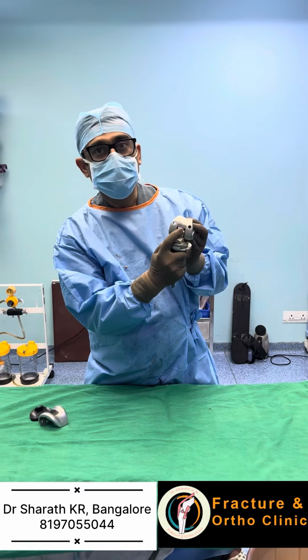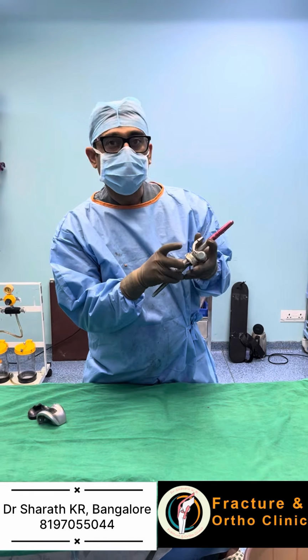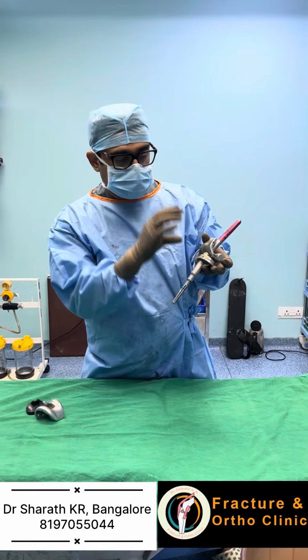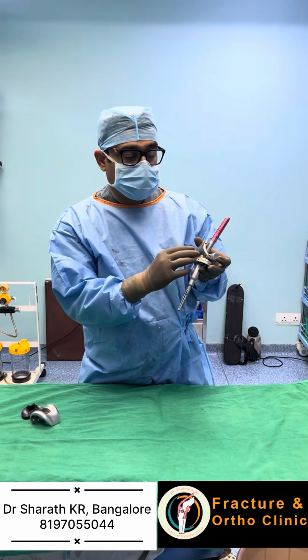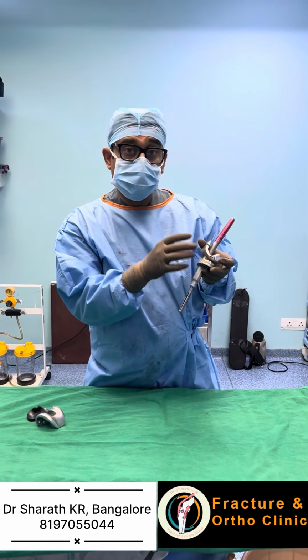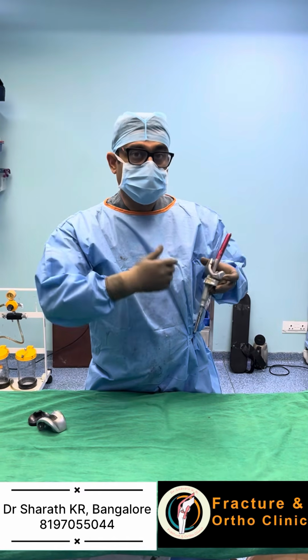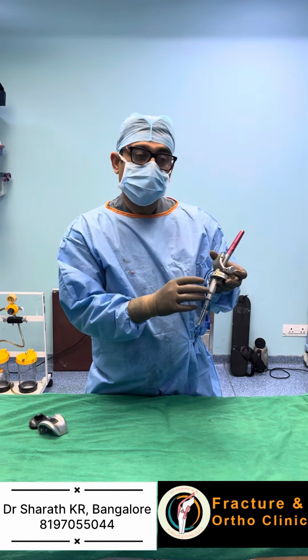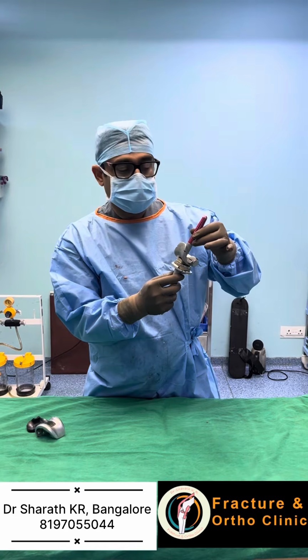This is a hinge. So when we use this hinge knee replacement is whenever there is absence of the collateral ligaments, whenever this flexion gap and extension gap is too much mismatch which cannot be adjusted by the semi-constrained implants, and whenever there is loss of bone, we are doing second time surgery and third time surgery, or sometimes there is no ligaments. So in such situations, this type of hinge knee replacements are used.